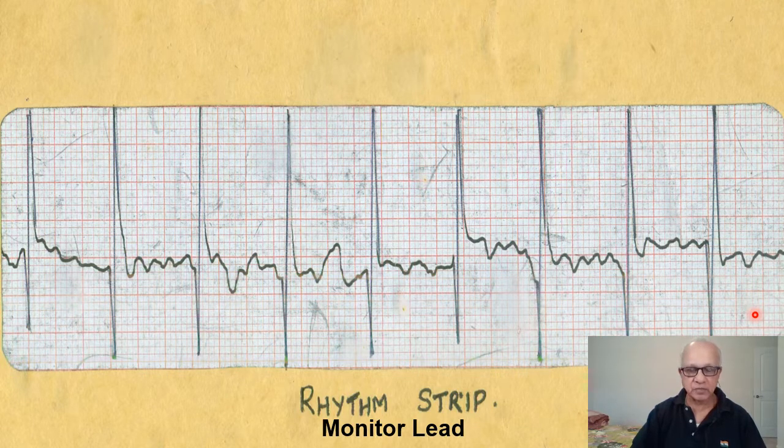Also, I said that this patient was in heart failure. The heart failure could have been due to the rheumatic valvular heart disease. It can also be due to a disease like, say, cardiomyopathy. A dilated cardiomyopathy also can present just like this in a 32-year-old lady. Now the third part of my question was, what was the cause of this particular arrhythmia? Or I said abnormality, it is this arrhythmia. So what caused this arrhythmia?